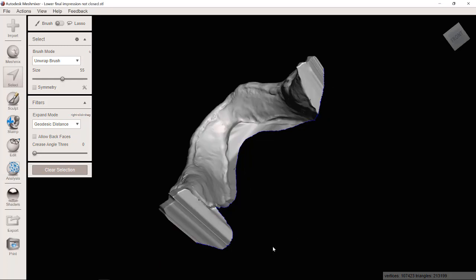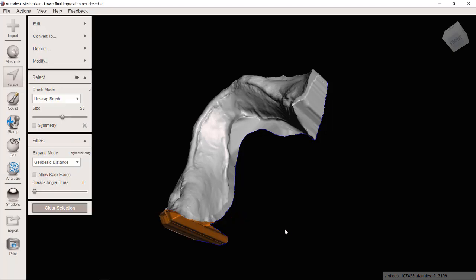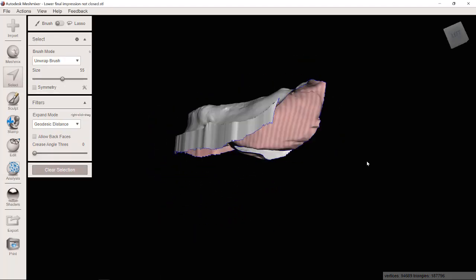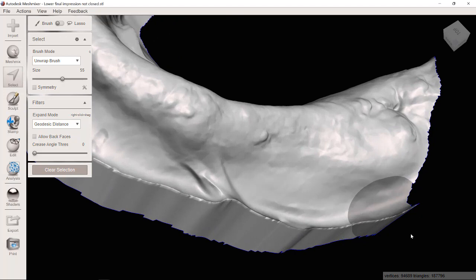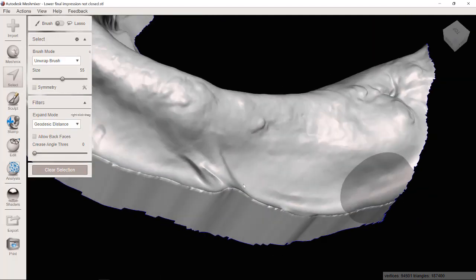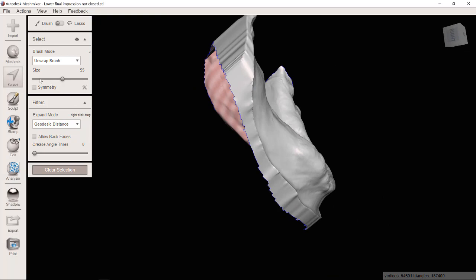Delete. And finally, let's just do this. So a bit of a hurried job, but you'll get the point. All right, so once we've done that, oh, see I have one little jagged area. Do you see this right here? I almost missed that. That would be a problem. You want to get rid of that and make sure that this is smooth. There we go.